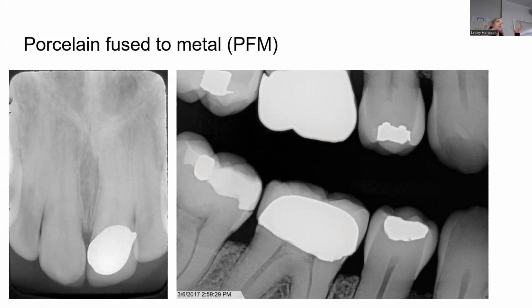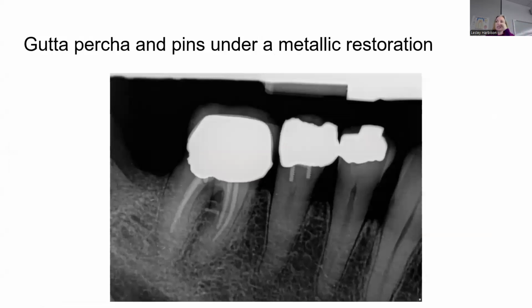People can have, I mean, that's not something that a dentist would probably recommend, but sometimes you can have a mix and match. Okay, here's some more. Root canals are harder because they're just used so many. I mean, I'm not an endodontist. Nobody here has probably worked for an endodontist, unless you have. Anybody worked for an endodontist? You're like, I have. You have.